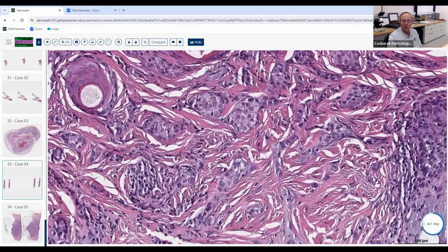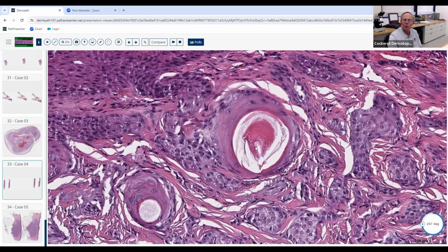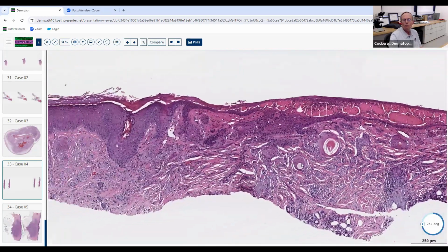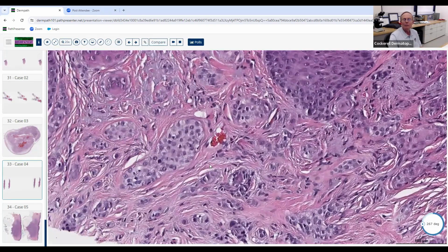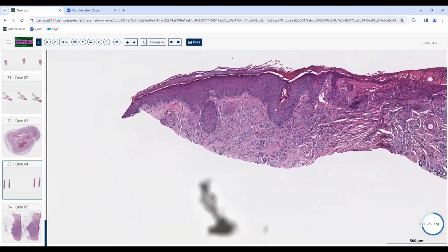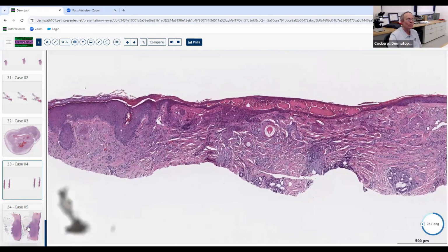And you'll often get these little mini milia-like cyst-like structures in this lesion. You also see those in desmoplastic trichoepithelioma, not so much in basal cell, but usually if you get those, you'll also see some more basaloid differentiation, follicular differentiation, plus the calcification. So this is MAC this time. These also tend to go into nerves. We don't have any nerves here to look at, but they often get into nerves.